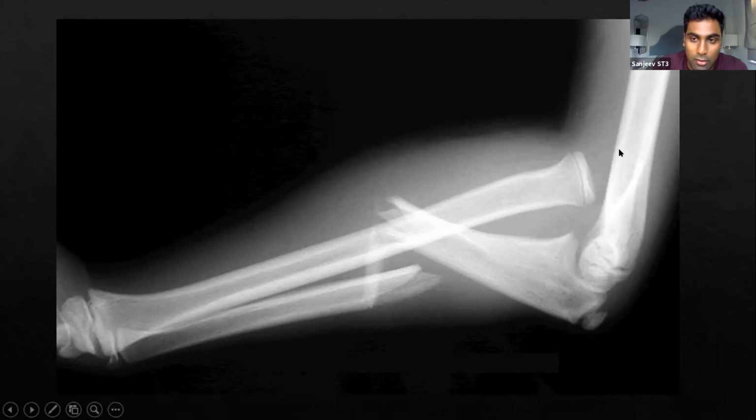Good, okay. So you're absolutely right. There's lots of elements to this, and I think you hit pretty much all of it. You've got the demographic details, which is really important. You mentioned that it's a lateral one.